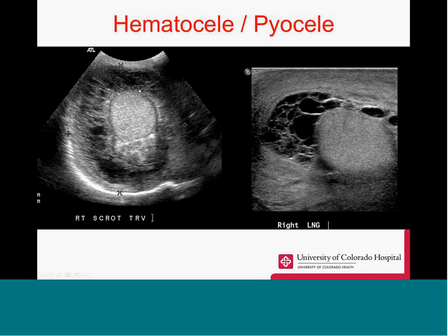Here on the left, we have a hematocele, and on the right is a pyocele. So you can see how they're very similar in appearance, and you'll have to use the clinical signs to decide which one.